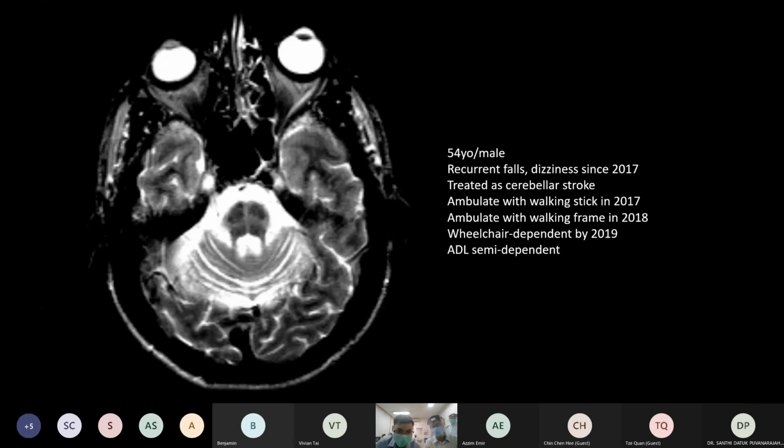The history for this patient is real, but the MRI does not belong to that patient, because I don't want to take any real MRI images from our clinic or our ward because of the digital contract that we need to sign. But the scenario is real.